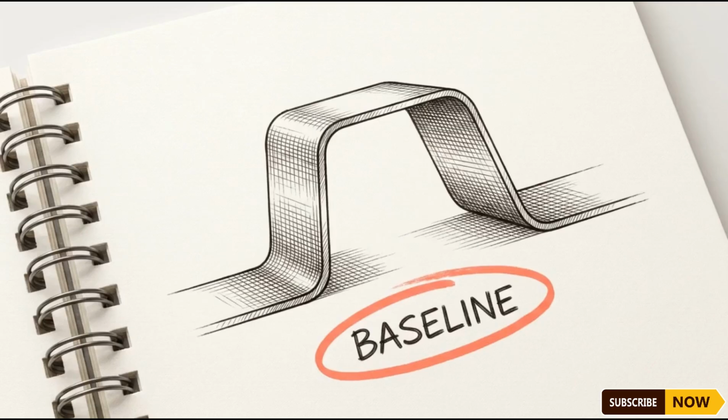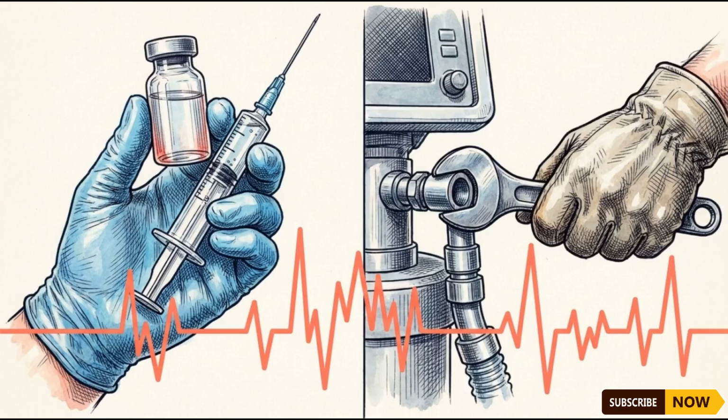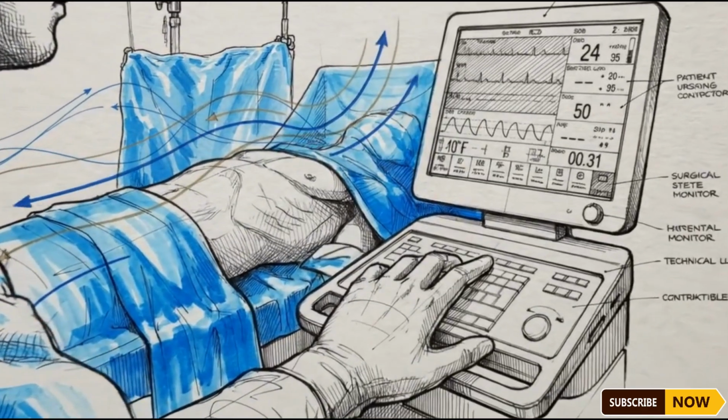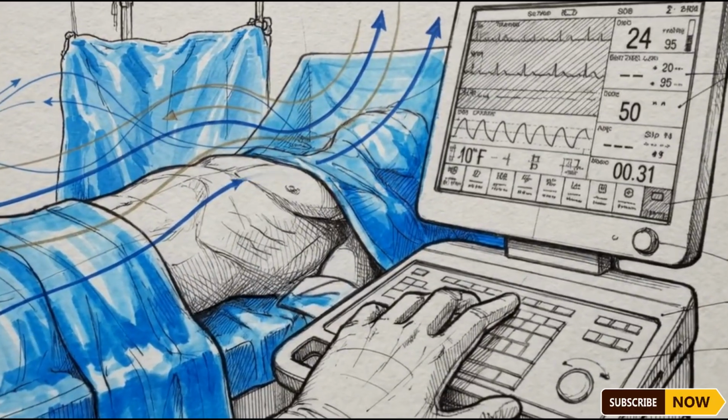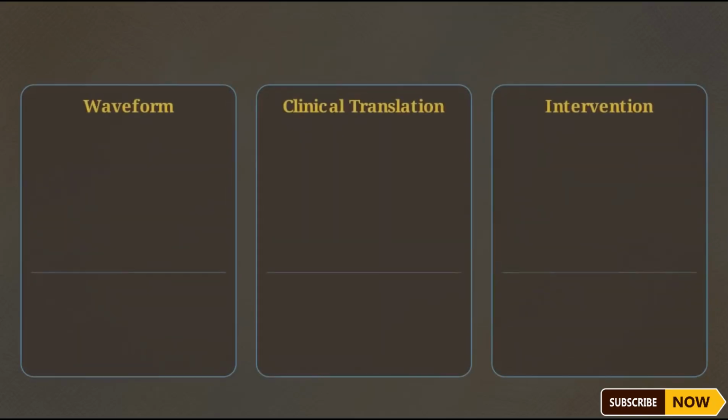By memorizing this precise boxy structure, you establish a baseline. Any deviation from this exact shape dictates whether you reach for emergency medications or start disassembling the ventilator. Let's look at what happens when the machinery is working perfectly, but the patient's internal respiratory mechanics are failing. This comparison matrix correlates the visual waveform pattern with its clinical translation and exact action required.